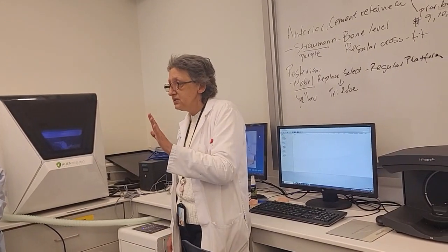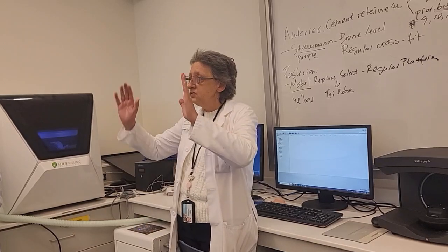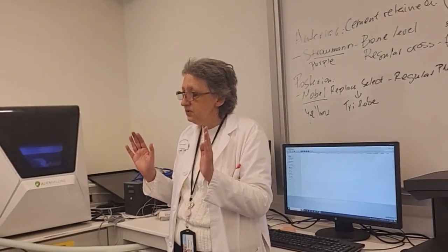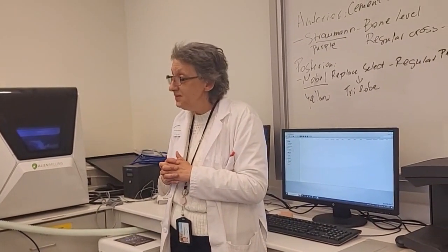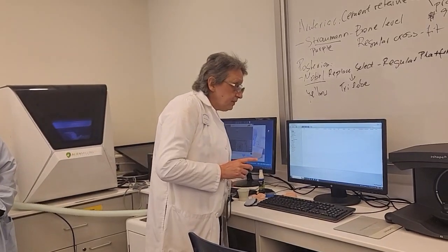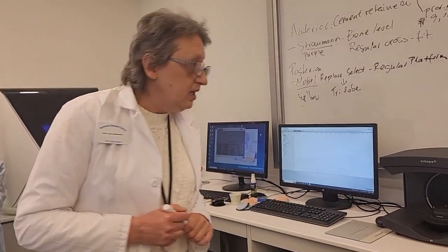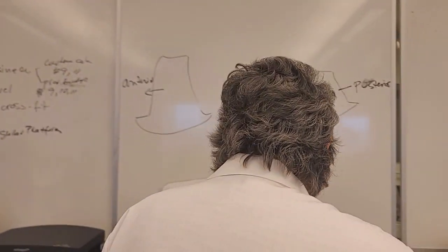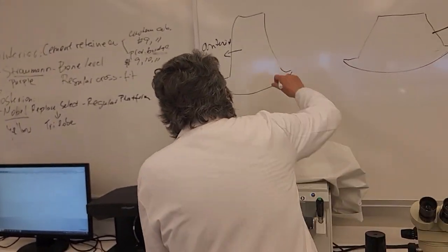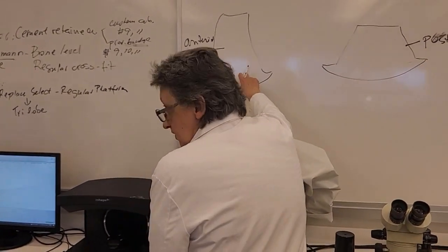Another thing that's very important in dental implants, especially when we're talking about a bridge, and we've been talking about this in lectures, is how the implants should be in relation to each other. Parallel, very good. So the implants should be parallel with each other. And also, another important thing when we design an abutment are the walls of the abutment, okay?